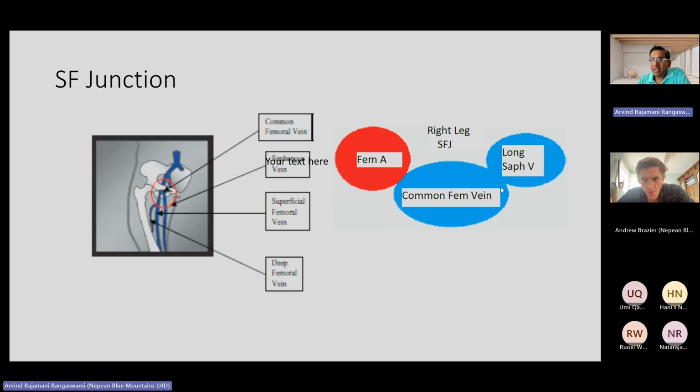The important thing, however, is that there is a discrepancy between the ears of the Mickey Mouse sign, and I'd like one of you to comment on what that discrepancy is. It's not an exact mirror image, and what is it? This is the shape and size. Okay, I've drawn it that way. So no. What else?